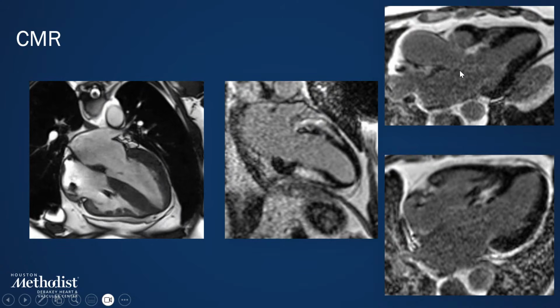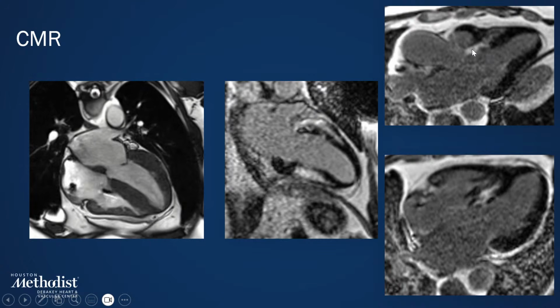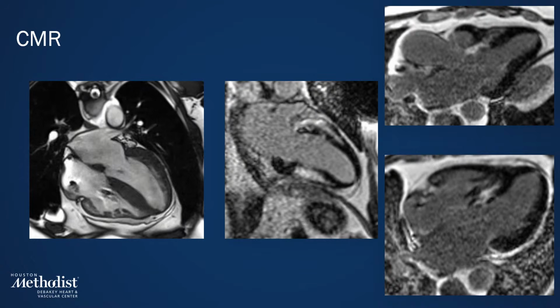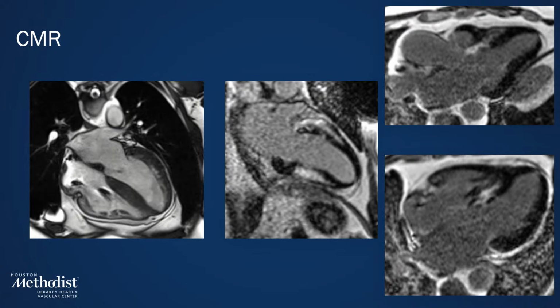And in the equivalent 3 and 4 chamber views, we can see that at the very basal end of the septum, it's transmural. So this was reported essentially as dense scar in the septum, basal to mid anterior walls and inferior walls, transmural at the basal segment. And the differential diagnosis at this point would be, could someone shout them out?